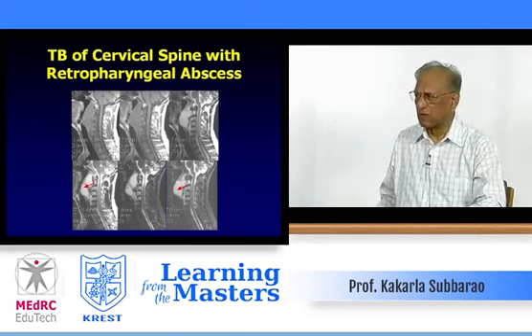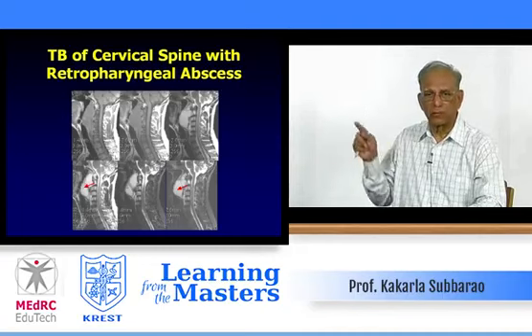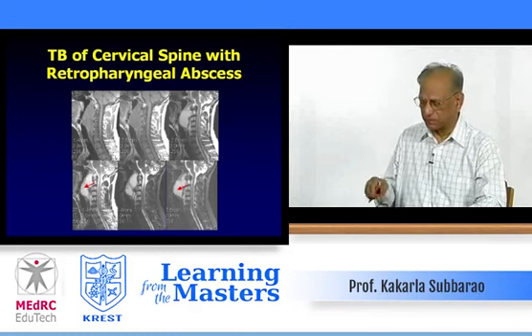And here, of course, in MRI of the cervical spine, you will notice a retropharyngeal abscess or prevertebral abscess, huge abscess causing dysphagia.